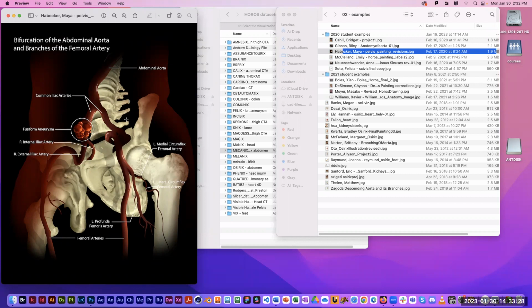Plus the dramatic lighting in here really makes this for kind of a dramatic image. But you can again see just that little hint of a skin outline up there, and then of course the internal anatomy with the bones and the vessels.